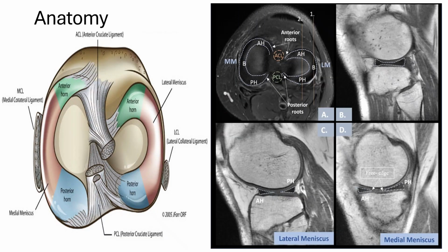So let's talk about the medial meniscus. The medial meniscus is a C-shaped structure and it has a larger radius, covering approximately 60% of the medial tibial plateau. We can see here, it is firmly attached to the tibial plateau and surrounding structures, and so it becomes less mobile. Therefore, it is very vulnerable to injury.